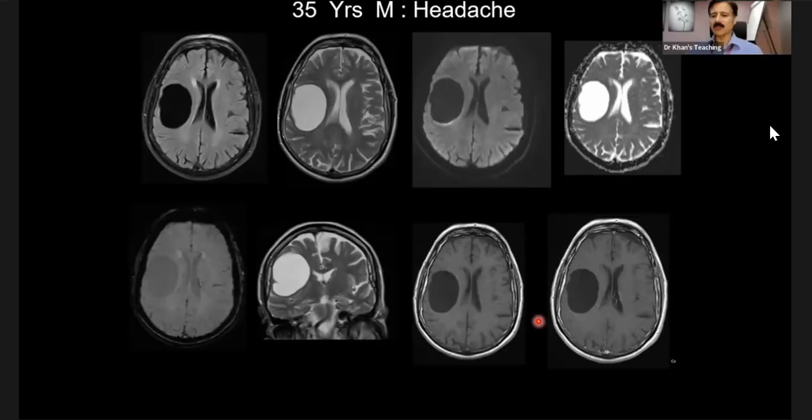Okay, let me give you a hint. You are doing the chapter of infections. Okay, hydatid. You see, hydatid has got unique features. In hydatid cyst of the brain, only about 1 to 2% of cases end up having hydatid of the brain. You can have various kinds of radiology, and according to the type, hydatid will have slightly different radiology. Please remember the classical daughter cyst appearance or membranes, etc.